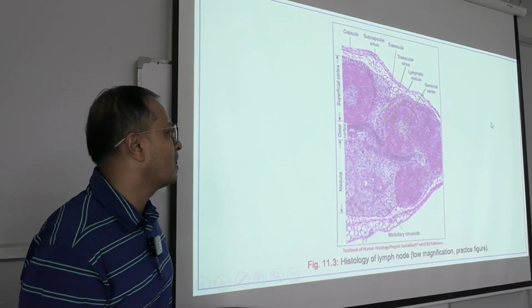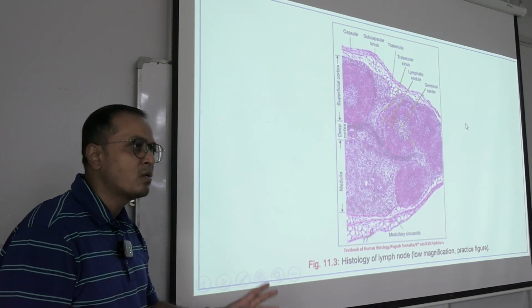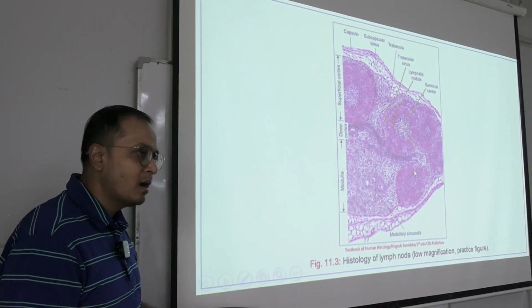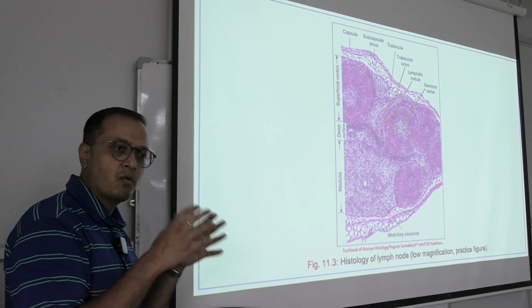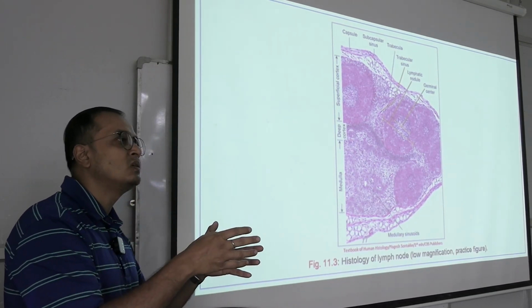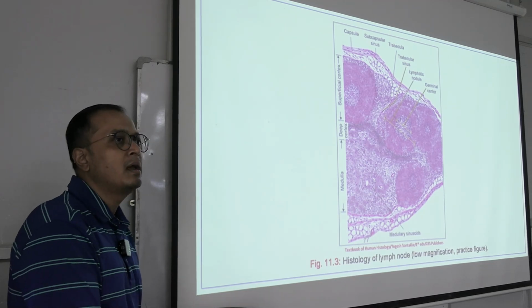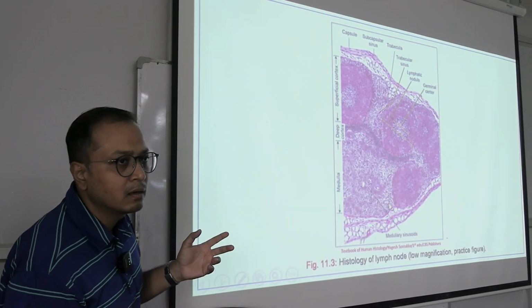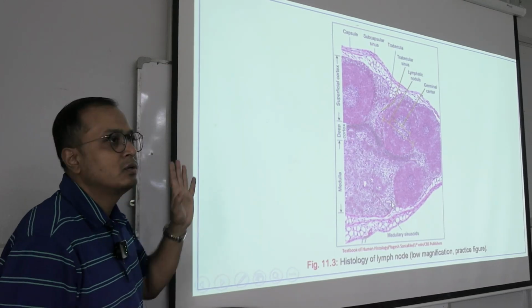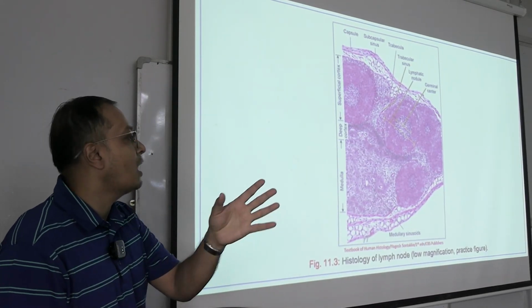We are not going to talk about those things because that dilutes this identification part, which I do not want to emphasize on. Right now, our job is to identify this tissue as lymphoid tissue, and lymphoid tissue to be specific is lymph node. It can be identified by lymphoid tissue which is visible like this. It could be anything out of this lymphoid tissue, whichever is present in here. But how are we going to separate these from the other one?